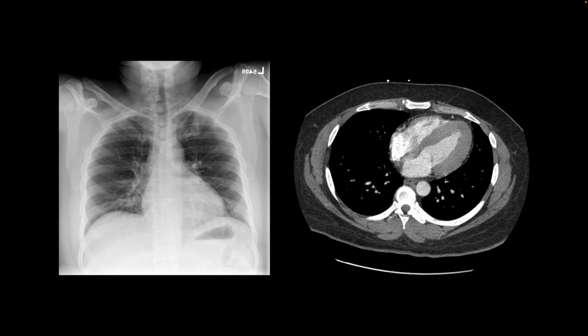and this is their CT scan showing that they do have left ventricular hypertrophy because the free wall of the left ventricle measured more than 2 centimeters in thickness, leading to enlarged cardiothoracic ratio on the chest x-ray, from left ventricular hypertrophy.